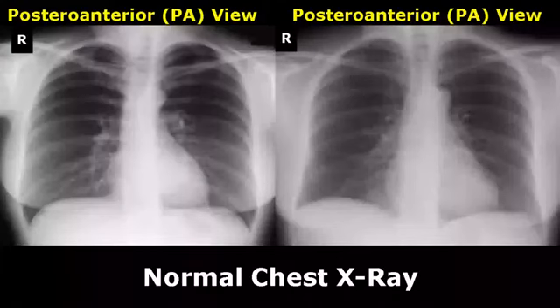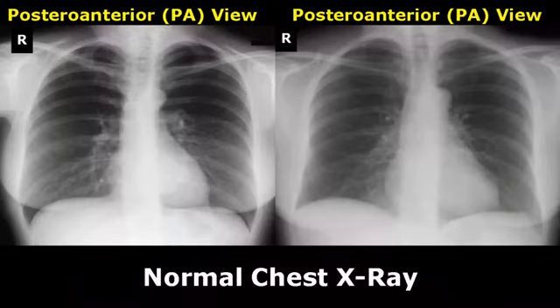Studying chest X-rays can be complicated. That is why it is important to have a systematic approach. We will only see lung diseases in PA view in this video. Here we have normal PA views showing clear lung fields.